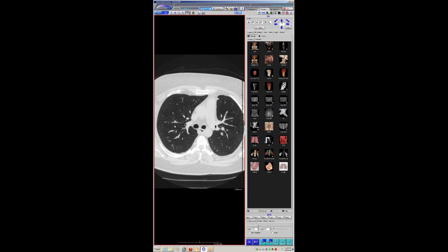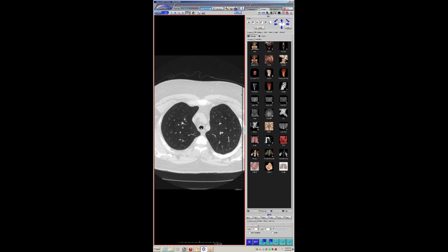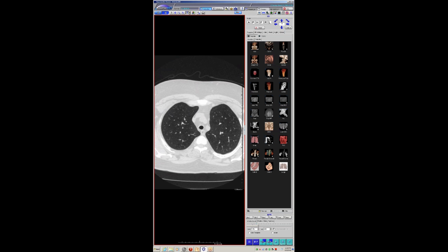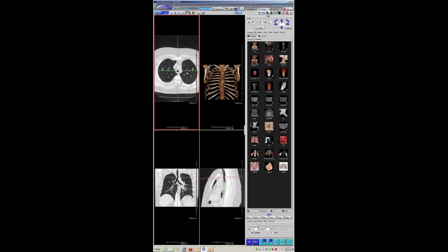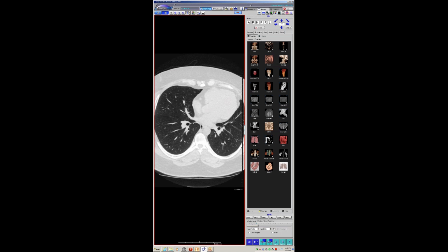I remember Howard a couple of years ago showed a pretty amazing case with thickening and edema, and also this crazy looking bronchoscopy image showing this really ulcerated plaque or ulcerated mucosa, which I still have, which was an amazing case. And actually, in my AFIP lecture, I give you credit. I say it's a nasty case, but here's just another case of tracheal involvement with GPA.